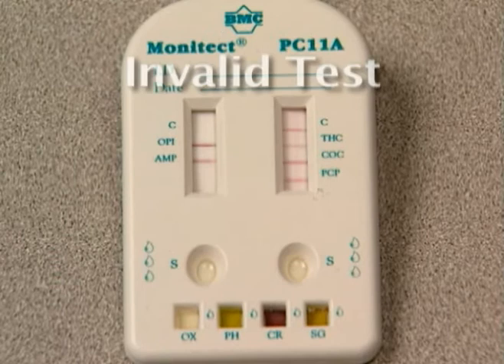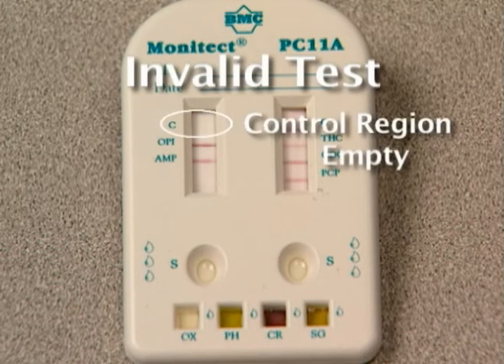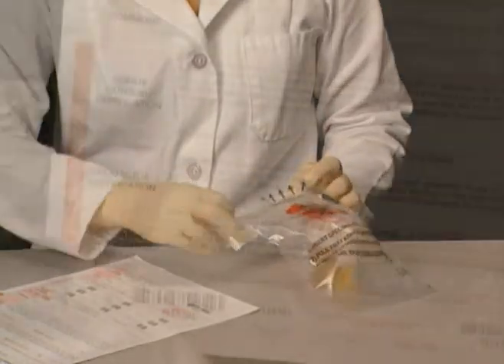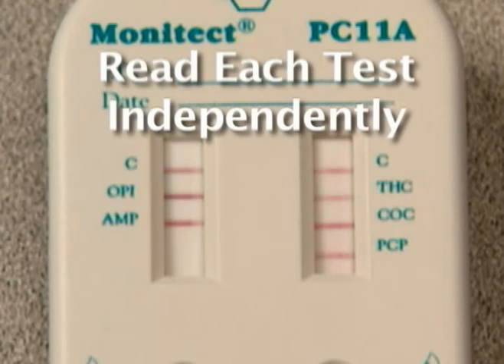When no band appears in the control region, the test is invalid, even if there is a band in the test region. In this event, repeat the test with a new device. If results are to be confirmed, follow the standard chain of custody procedures. It is important to read each test independently. Do not compare color intensity of one test to another.